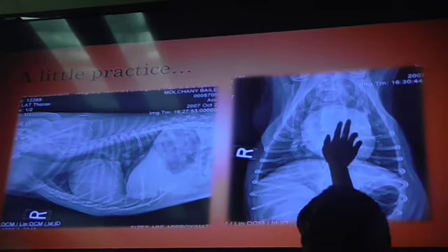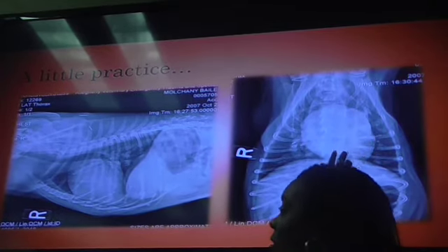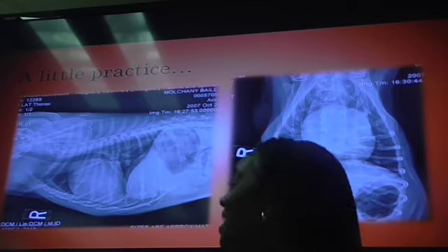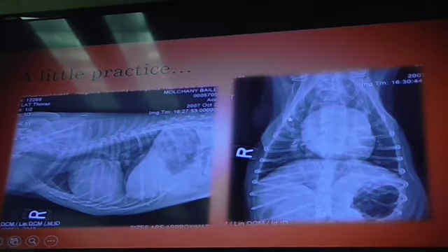See this? That tip right there is the tip of the tail. No, why would the tail be that long? I mean, then what is this? I don't understand. All right, so let's think about that. Why would it anatomically be narrow if it's the esophagus?